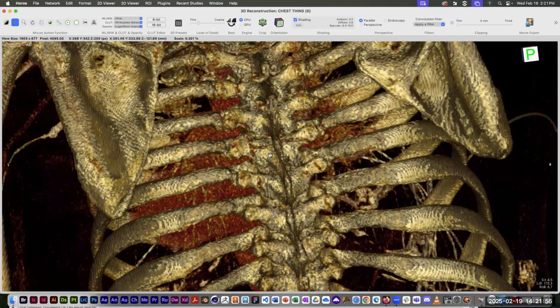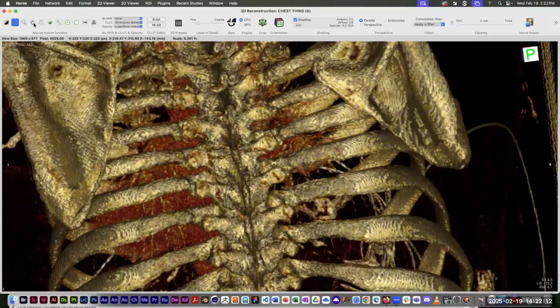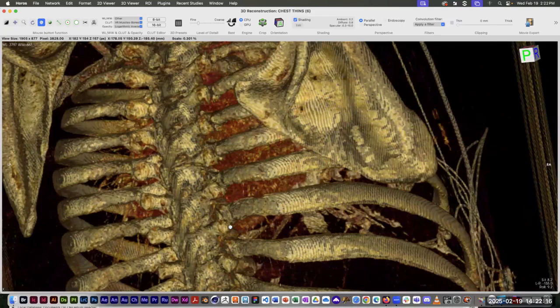This is T5. And I don't know if you can tell, but there's a line going across T5 that shouldn't be there. That's actually a fracture that goes clear across both transverse processes and both lamina at the T5 level. And if I removed his heart or got rid of some of the anterior stuff and looked in here, we'd see that there's also a fracture of the vertebral body at that same vertebral level.